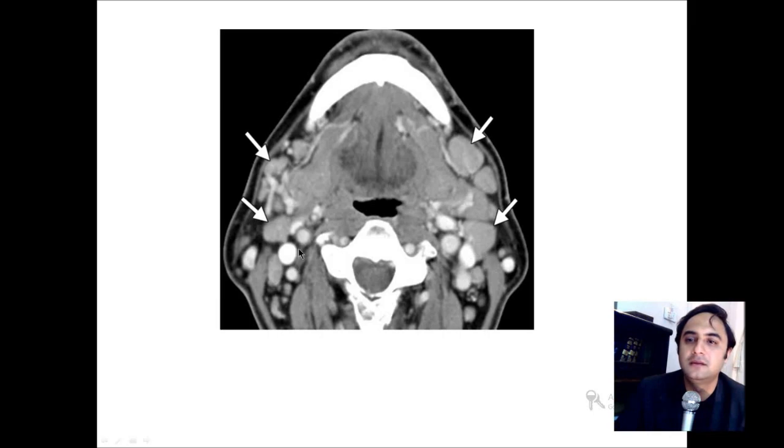these are the great vessels of the neck. These two small ones are the vertebral arteries, and these are the longus capitis, and these are the inferior constrictor muscles of the pharynx. And you cannot differentiate them by a clear line. However, in an MRI, they can be visible.